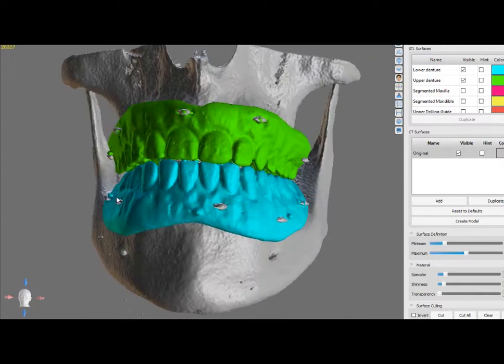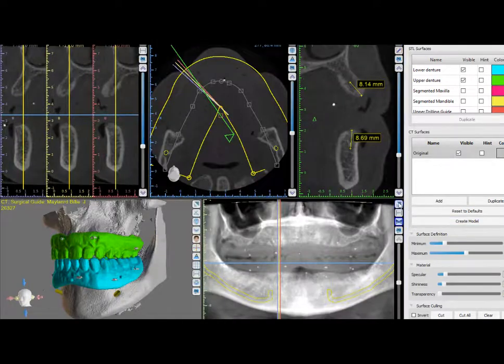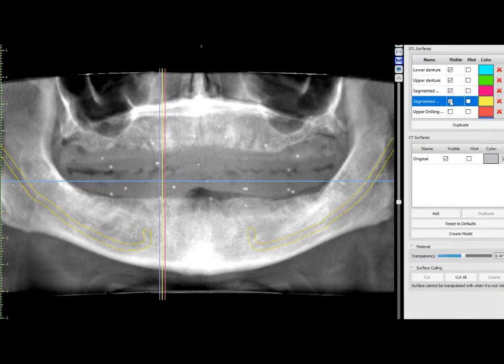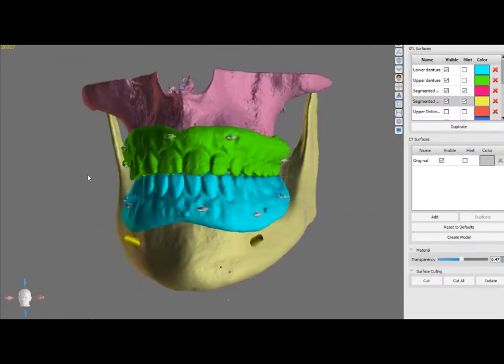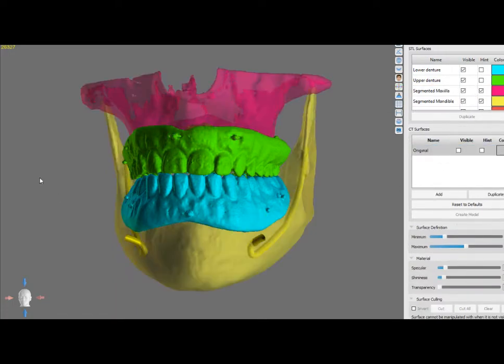We also take full face photos, which I'll show you in a second, and then eventually we'll go ahead and start mapping our mandibular nerve, which is quite simple to do, and often again, AI features will generate the nerve for you. Once we do this, we'll start to plan our implant positions for the upper and lower arches, and then we'll need to go through advanced segmentation for the upper and lower, being able to turn the DICOM data of our upper and lower arch from CT scan data into segmented maxillary and mandibular arches.